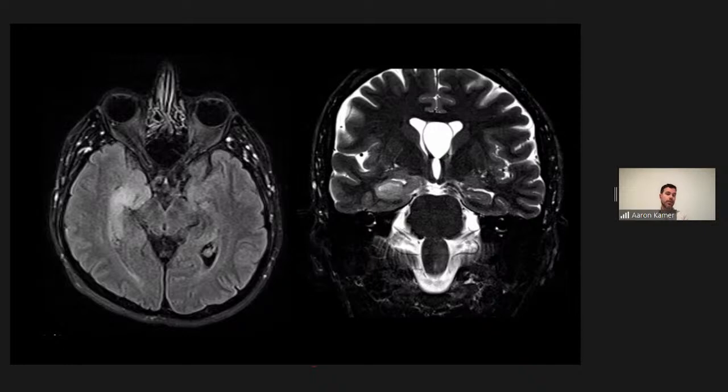So in this setting, I might be wondering about something similar to what Stephen mentioned last time. Maybe the patient had a recent seizure that caused some edema in this structure, or maybe the patient is having some sort of more acute stage autoimmune encephalitis. Maybe there's, can you think of any infections that like to affect the hippocampus, Monali?